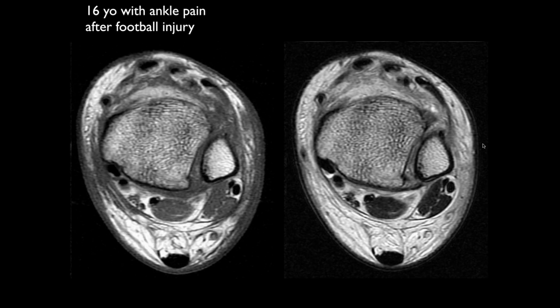Right here, there's a separation of tibia and fibula a little bit because of the high ankle sprain. Yeah, there could be. You need to compress this back in place. I think there's some displacement there, a little bit. I think you're right, John. But so that's the mechanism.